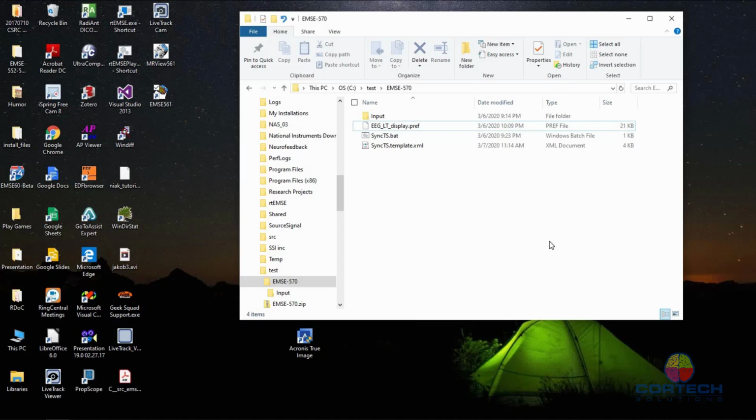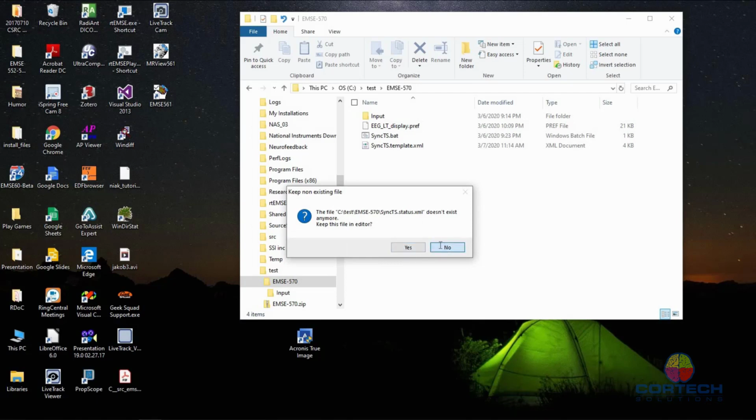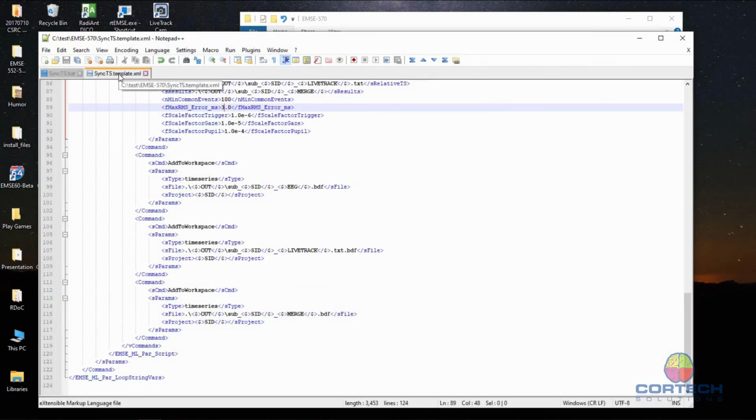Okay, so now we're back to where we were, except in my template, now I've set the quality criterion to be 3 milliseconds.